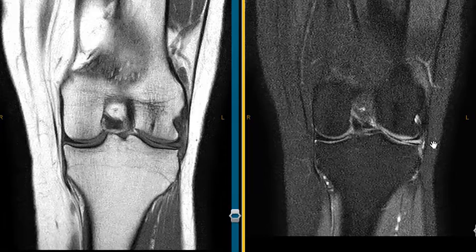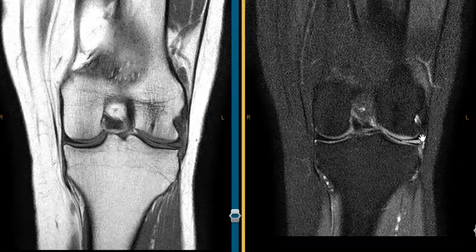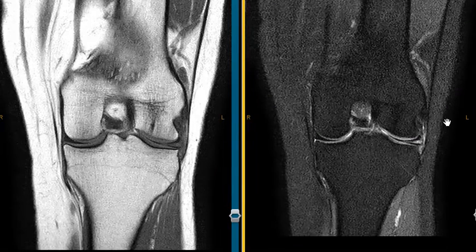So at first glance you might say, wow, this is a meniscus tear. Look at that clear abnormal signal in the meniscus. But a meniscus tear by definition must touch the top or bottom, the superior or inferior articular surfaces. So if a surgeon went in to look, they would see that the tear would contact the top or bottom for a true tear, but this does not.